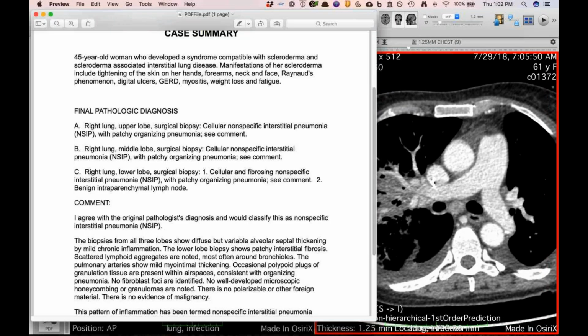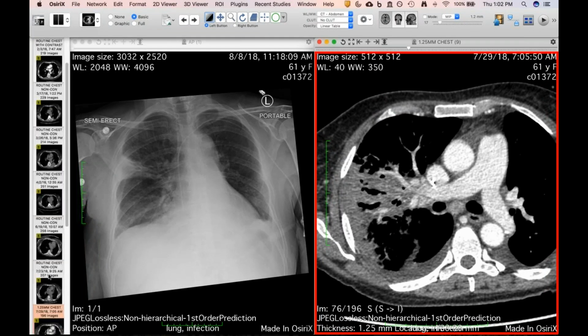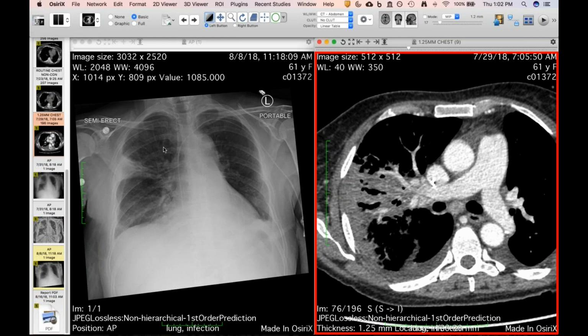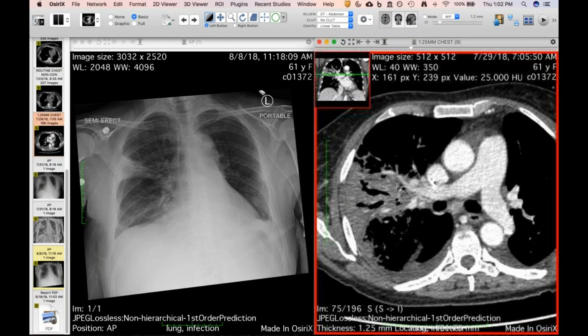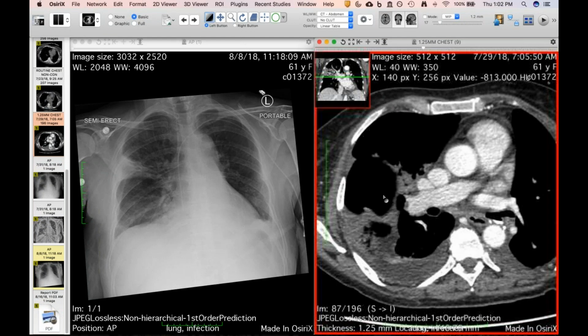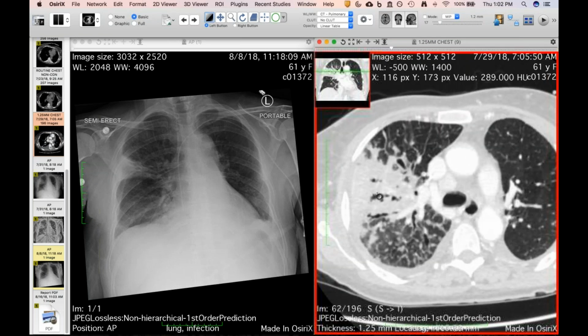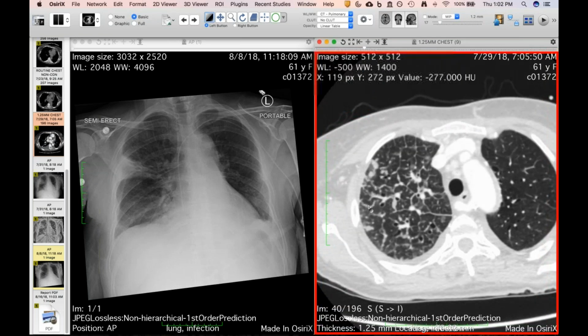Got it. So yeah. On that follow-up, the lobar edema interstitial is still conspicuous. It's just such a lobar process. Yeah, a little bit. So she's actually scheduled to get a follow-up CT this week. This was now just over a week ago, but I thought you'd like this because it's just so profound. Mm-hmm. Yeah, it is. So it's a pearl. Lots of pearls.